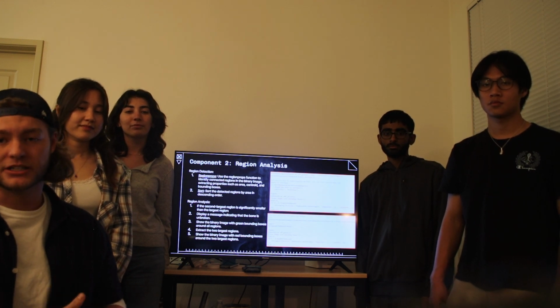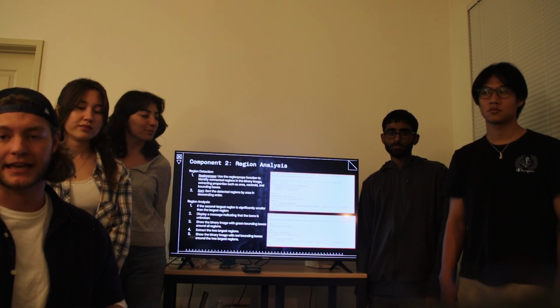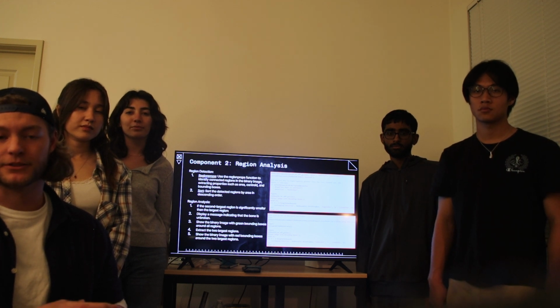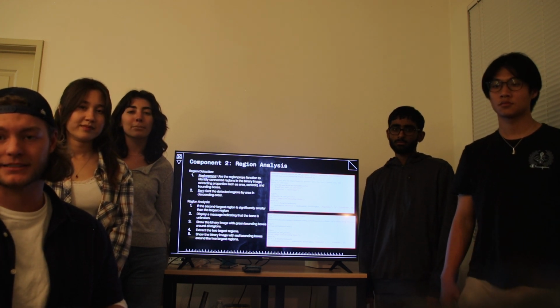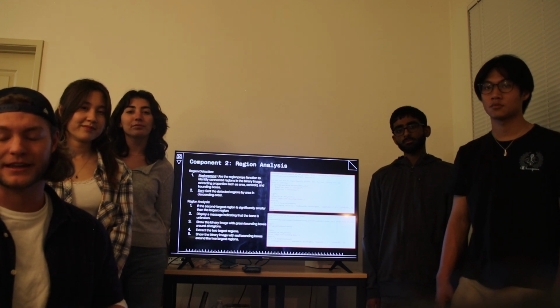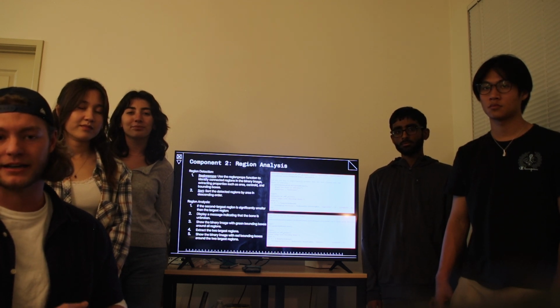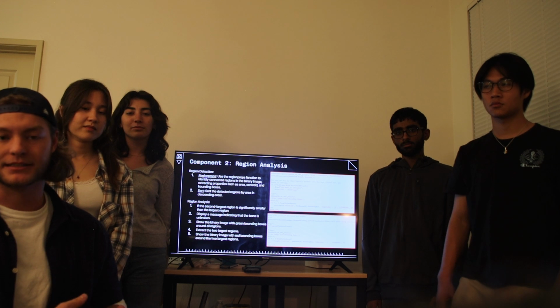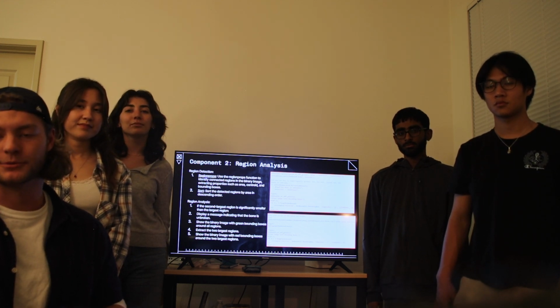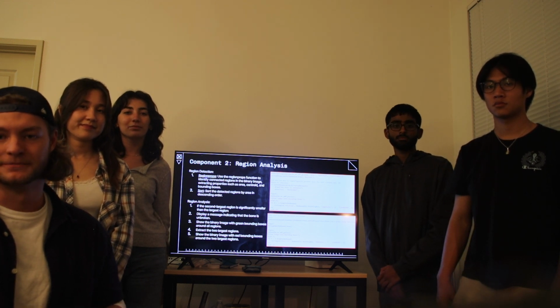Then, in region detection, we converted this thresholded grayscale image back into binary. Using region props, we found the two largest bounding boxes within the image, and if there's two bounding boxes, we knew that the bone would be broken, and if one bounding box greatly outweighed another bounding box, this process would recognize that the bone is in fact not broken, and this would be one giant bounding box, and it would be green, saying the bone is all good.